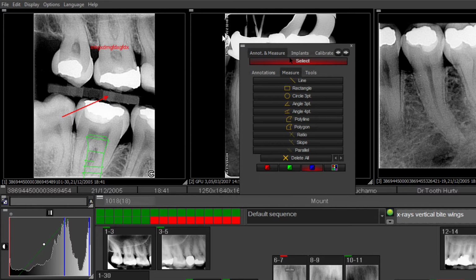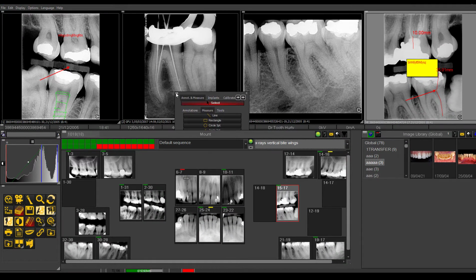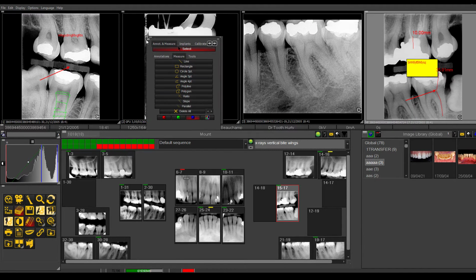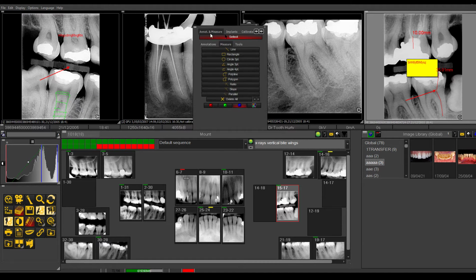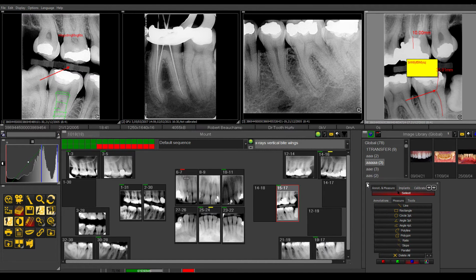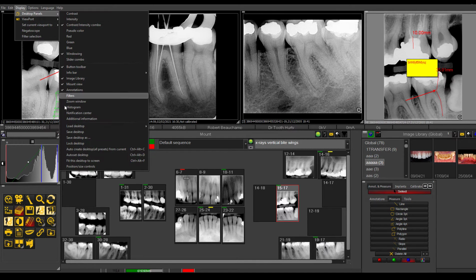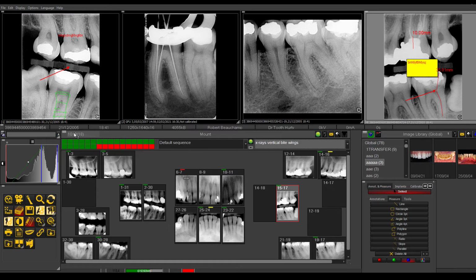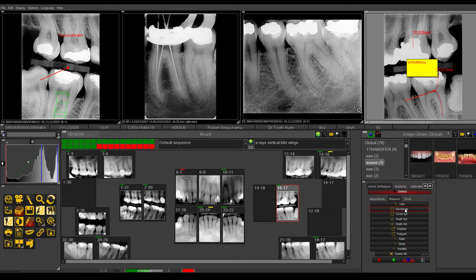Once you've unlocked, you have these two little lines at the top of all these windows. And what happens is if you grab it from these two lines, you can move it around and you can put it wherever you'd like. Okay? So this is where you can choose where you want this to open up. So if you wanted to open it up over here, you could do that, and then what you have to do is go Display and then Save Desktop. Okay, so once you've done that, it'll save that there. So when I close it and I reopen it, it'll always open in that spot.